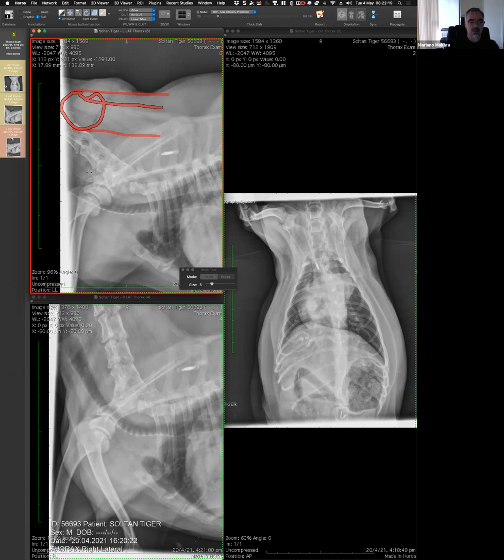The other situation, which is a lot more concerning, is if there is going to be something like this. That's a complete collapse of the trachea. And then maybe a membrane there. But in this case, what we are missing is that one, which is the tall one, the cartilage. So here the cartilage is failing. So basically here there are not three lines, or there may be three lines, but then the actual diameter is reduced. So that's the classic tracheal collapse.